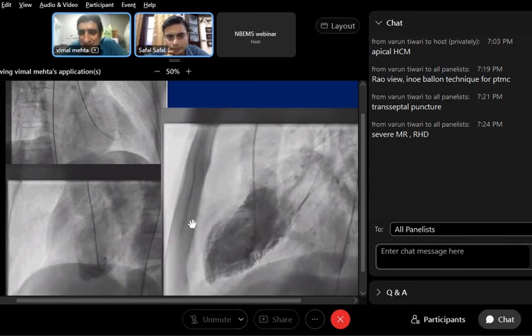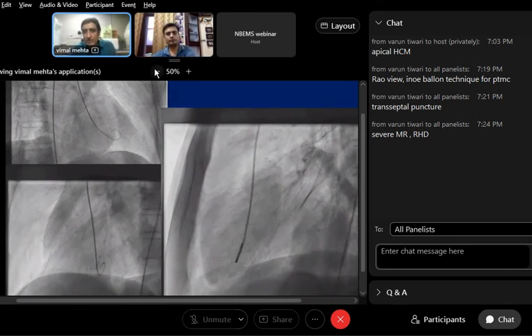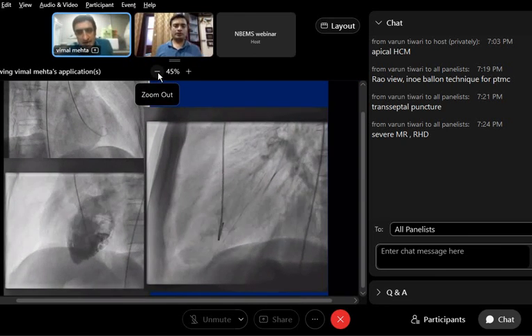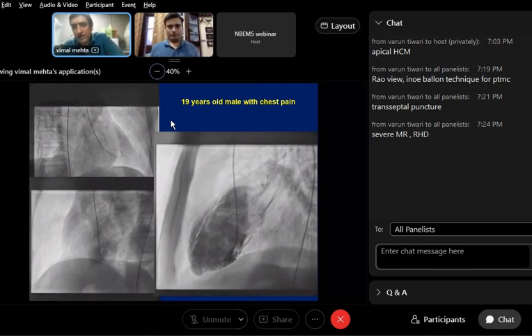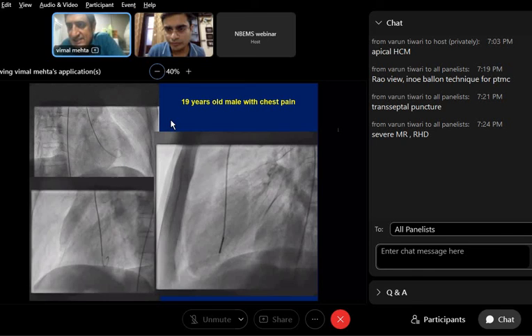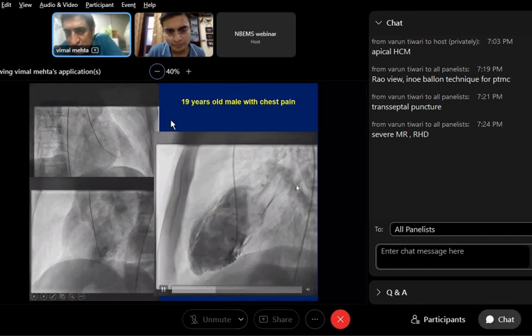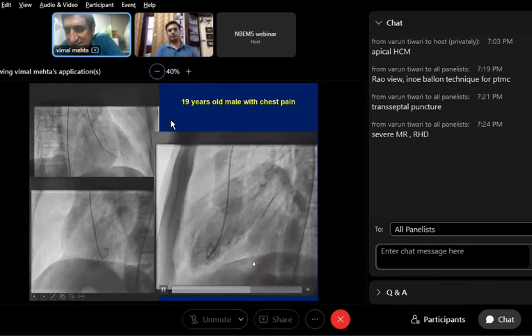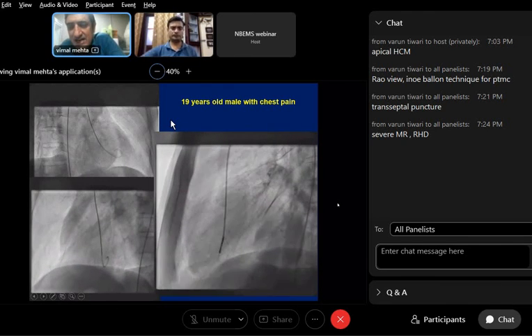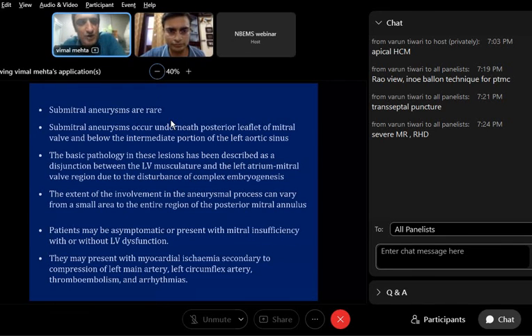So this is an aneurysm actually. First you have to tell. If you say aneurysm, I think you will get 99% marks. For the 1%, you can always debate because somebody has said mitral aneurysm. So in one or two lines, this is an aneurysm. This is a rugged cavity, this kind of thing. They can rupture and create havoc, so they need to be treated. But surgery is not without harm. Lots of mortality with surgery. They are rare. Last slide.